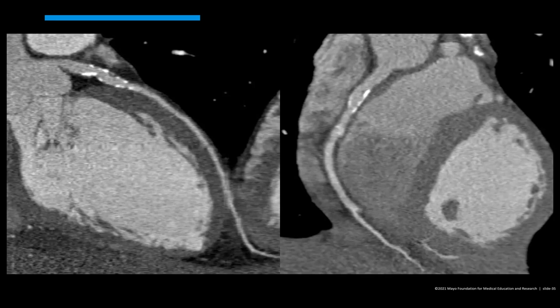And so really, this is a scenario where if you were doing an oral board exam, you'd want to ask the examiner, how old is the patient? And then based on the answer, you would say, in this 15-year-old, this is Kawasaki's disease. Or if they told you he was 75, you'd say, this 75-year-old has atherosclerosis.